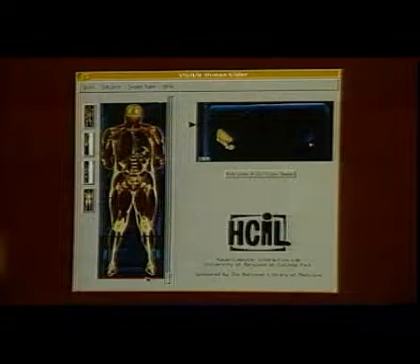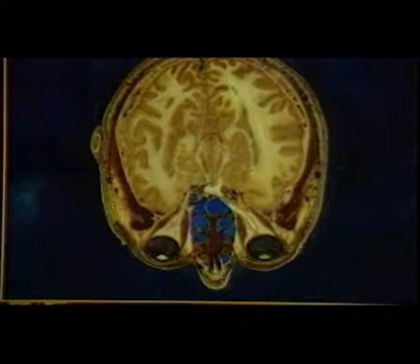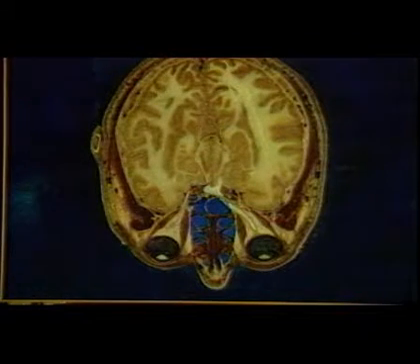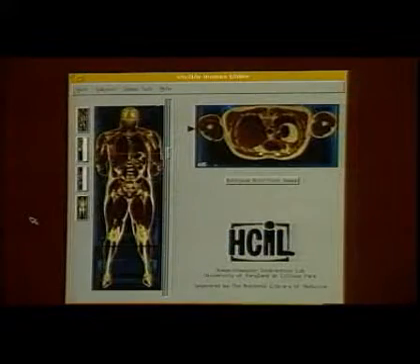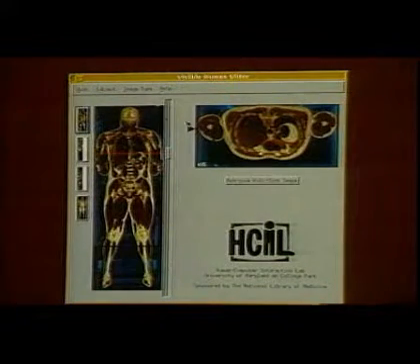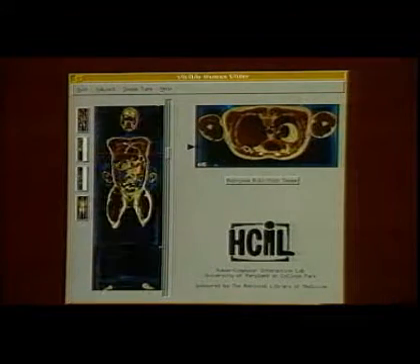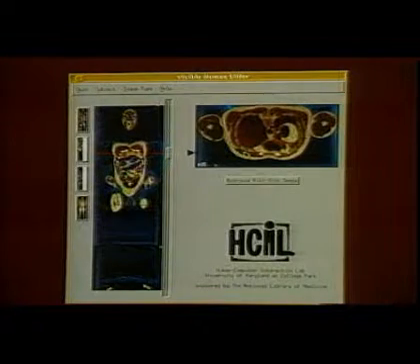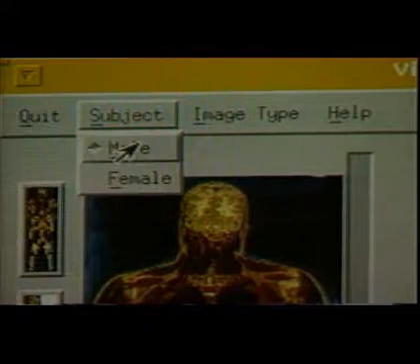When we have located the slice we desire, we press the Retrieve button. The corresponding full-size image is retrieved over the network from the NLM archive in a couple of minutes. We provide several useful alternative overviews, and also the ability to generate any coronal section overview, for example, near the back of the body or near the front. And the ability to select between different subjects and image type datasets.